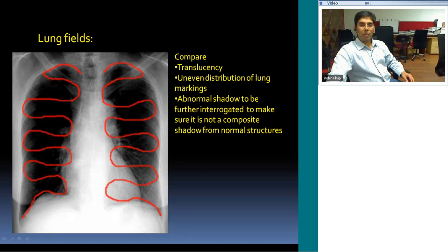So that comparison really helps, comparing to the opposite side, the opposite lung. So always follow a pattern, examine each and every part of the lung so that you do not miss small nodules or any abnormality. It will be good practice to carefully observe the lung fields in a systematic way. Do it from the top and then start again from the lower part and then go up again. Do it a couple of times so that you don't miss any of the lung field.